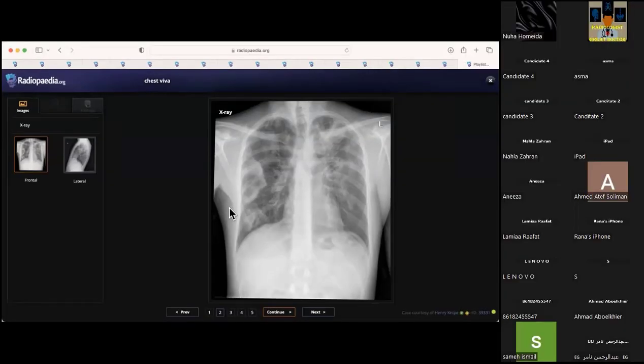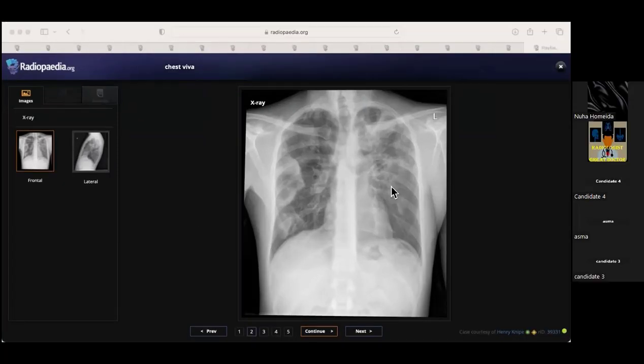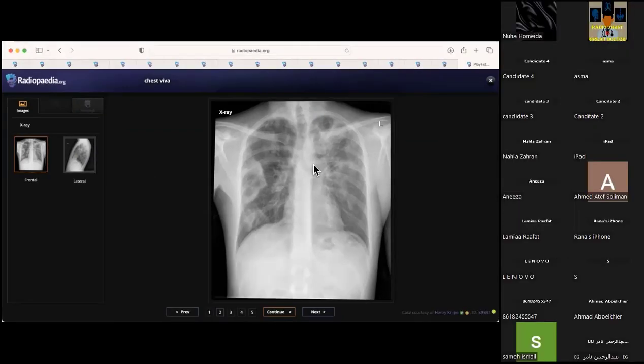There is no calcification. I can see that it is not solitary. I can see another one; in the previous film, I didn't see it. I can see that there are two pleural right lung lesions. I cannot appreciate an obvious left side one. It could be one. Yes, it could be another lesion. So to summarize my case, this is a case of pleural-based bilateral lung lesions.